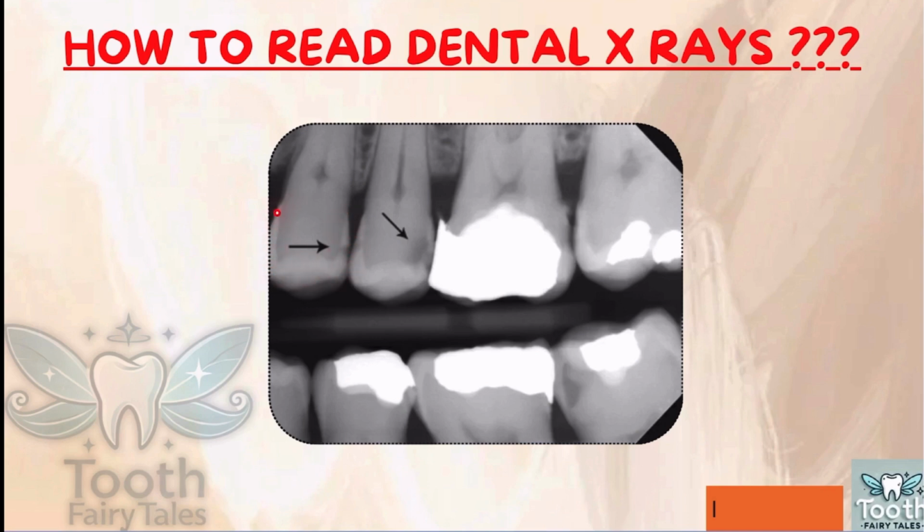This is called the enamel of the tooth, which is the first layer of the tooth, followed by the gray layer here, which is called dentin. And the deep layer here is like a thin line. This is called the nerve of the tooth. The scientific term is the pulp. And we can see here two sets of teeth, the top teeth and the lower teeth. They belong to the top left side here and the lower left side here.